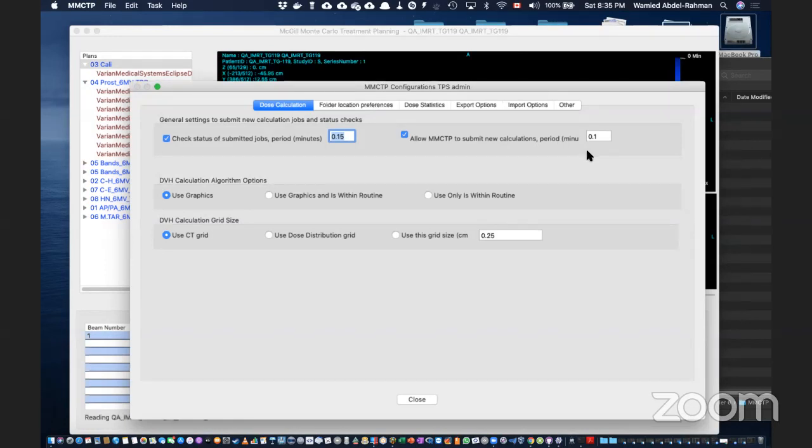So remember when I clicked on the button, you saw the job got submitted quite quickly. By default, this is going to be 1 minute. That means when you hit that check button, it waits for approximately a minute before it checks whether anything needs to be submitted for qualification and so on. So if you're impatient like me, come to this configuration and just reduce those values.